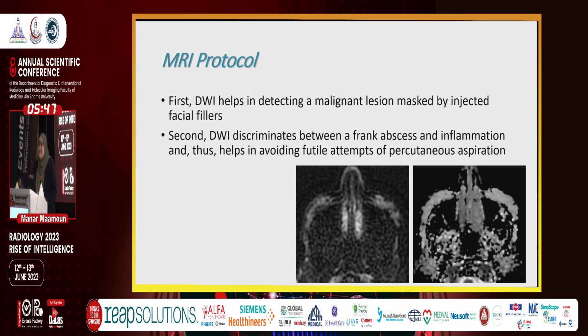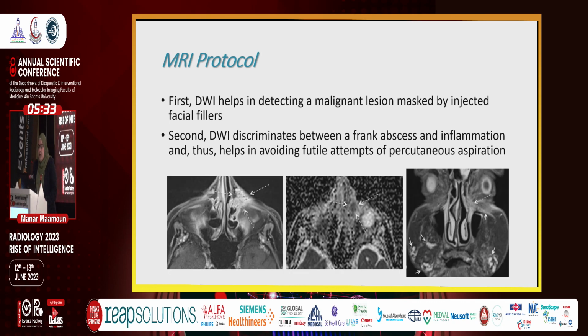Diffusion-weighted images are essential in such cases because they can discriminate abscesses and inflammation, because the filler usually shows facilitated diffusion in normal asymptomatic cases. It is very common to have another problem for which you have an MRI, even if you have previously injected filler.